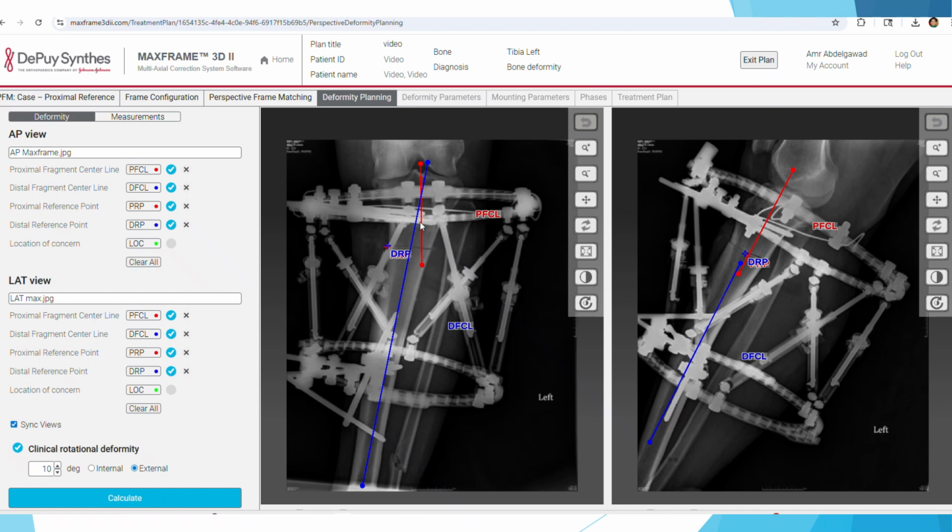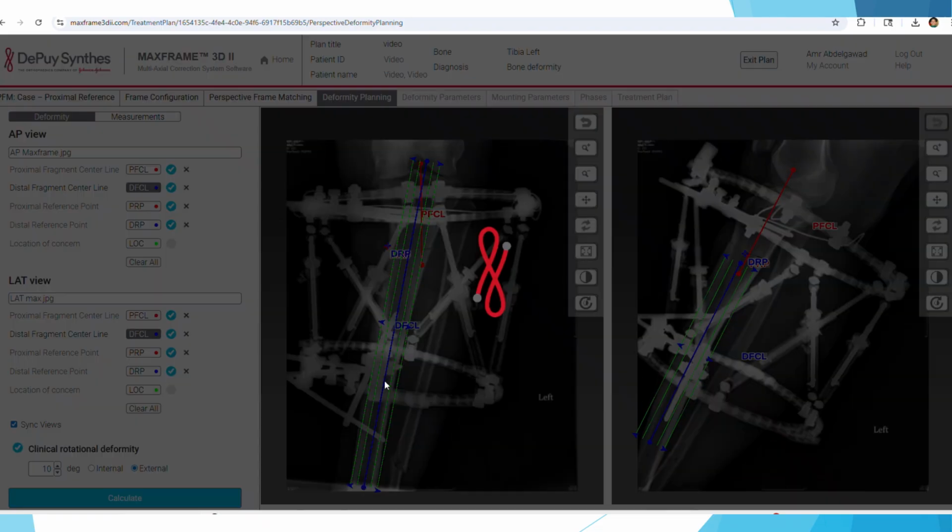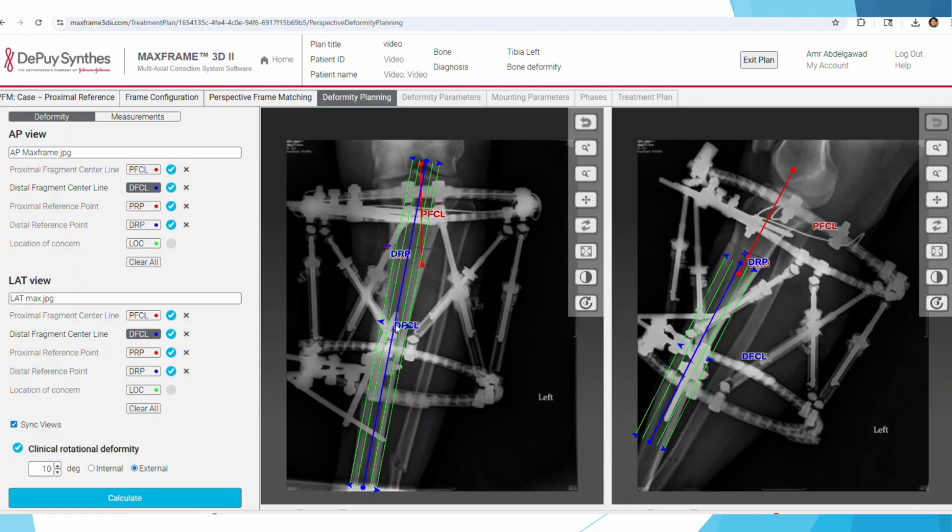What is the best option? The best option is you will go back here to the proximal, make sure that you did it perfect, in the center. And then the lateral, the distal part, I would just maybe move it a few degrees this way. Make sure we're in exactly here, and then here, and then now, okay, this is here, and then here. The proximal one needs to be 89 degrees. And I'm going to show you how to do this.